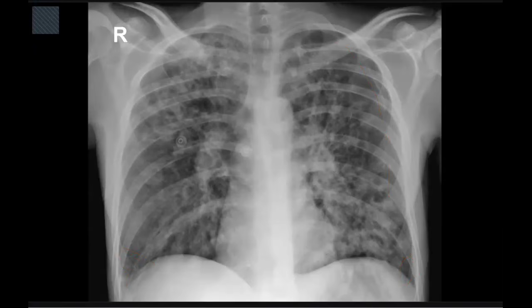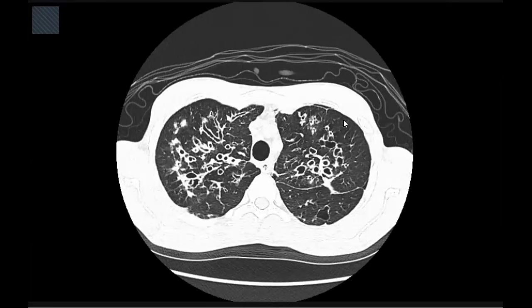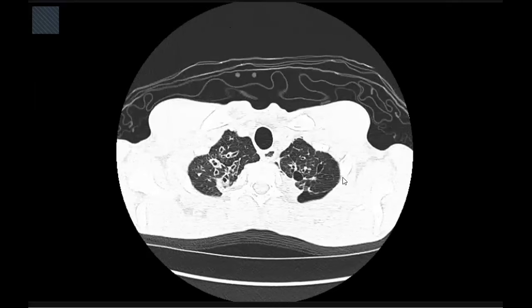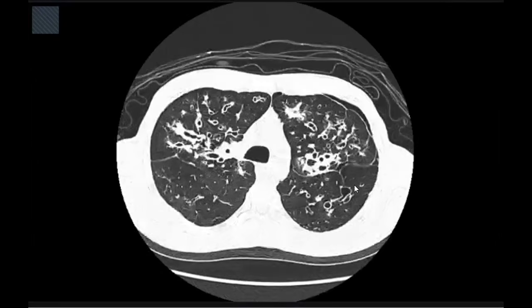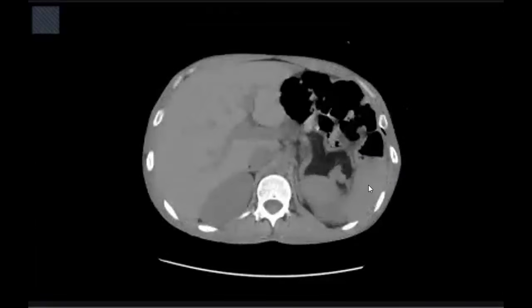Cystic fibrosis is the first differential. The CT scan confirms the presence of cystic changes and tree-in-bud, but as you told everything very well, and most important, you asked for the mediastinal window to see any associated lipomatous transformation of the pancreas.